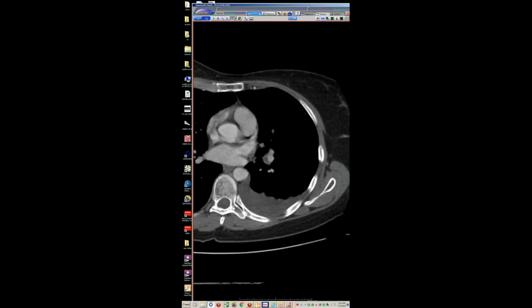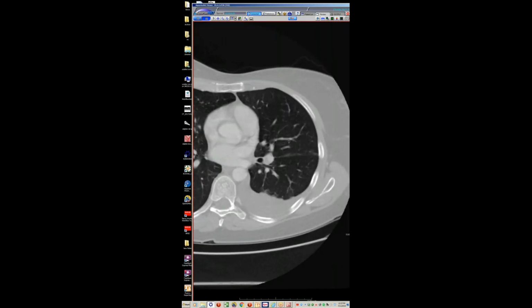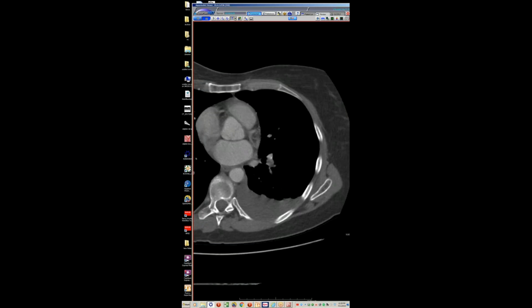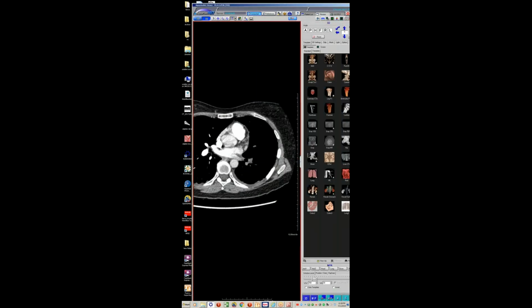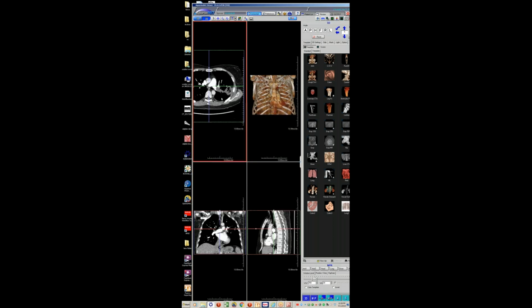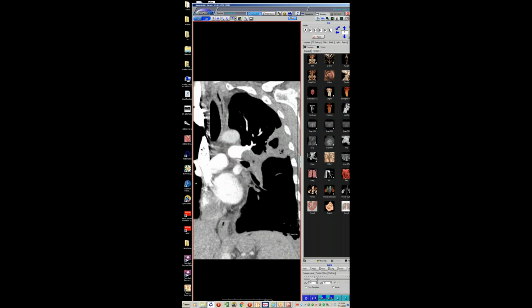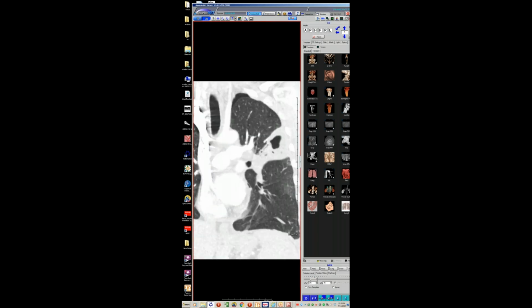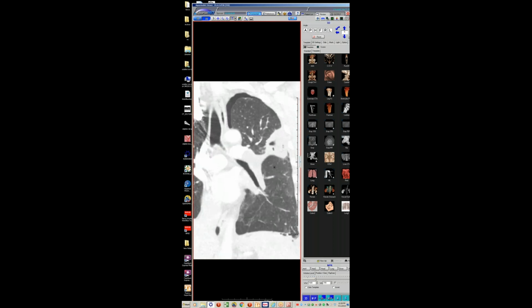And I think if I saw this now, I would just call this chronic thromboembolic disease. Honestly, I don't even know if it was caught on the outside study, but she comes back many months later with worsening chest pain. And now that little thing that looked like just an eccentric focus of thromboembolic disease has now grown up into her left lower lobe PA, and she has this massive infarct. And this massive infarct actually caused a pneumothorax, which is pretty impressive.